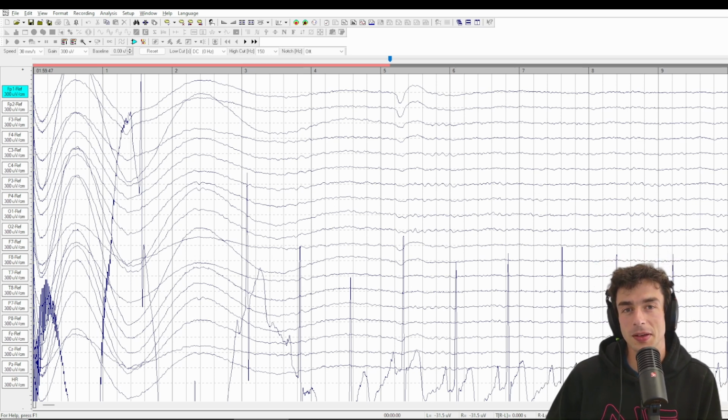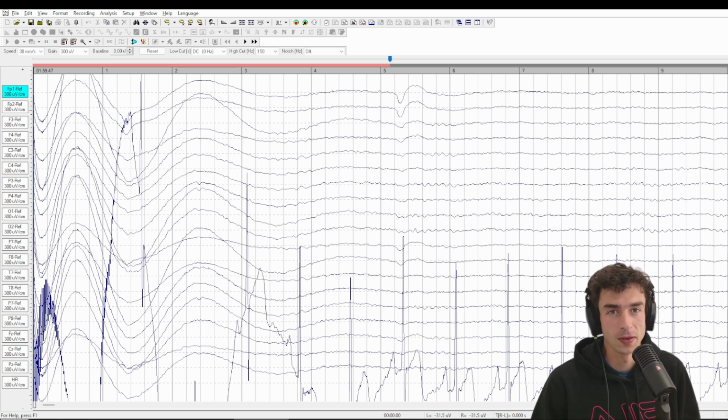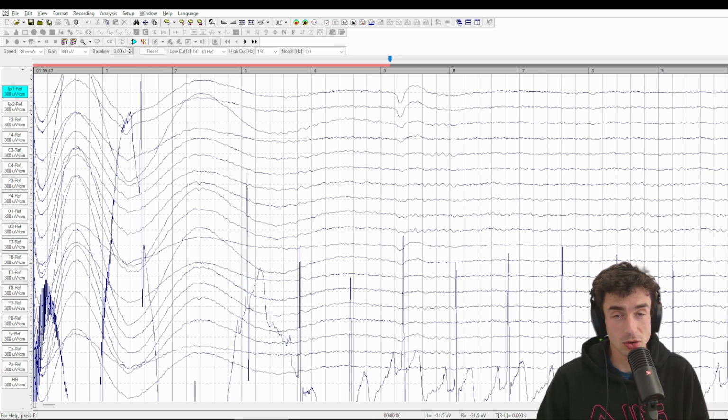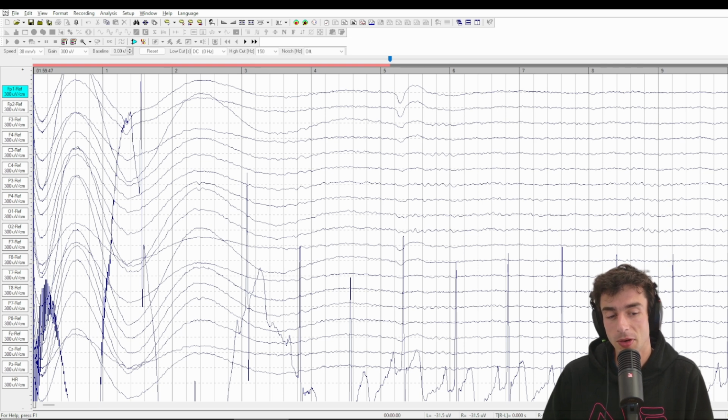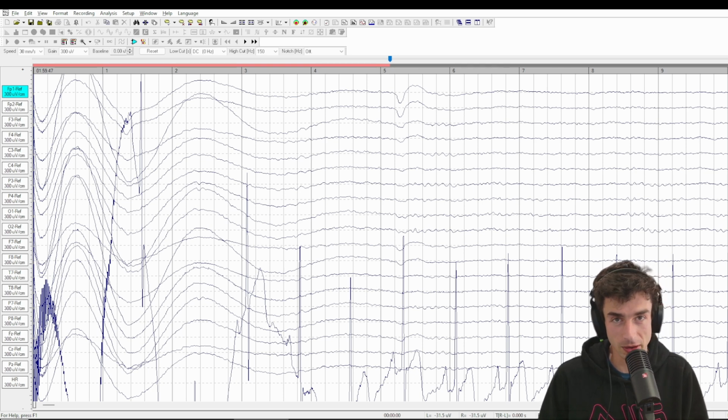My name is Nikki, and today we're going to be analyzing an EEG. Thank you to James Kroll from Bay Area Peak Performance for submitting this data. I've not seen this data yet, and we do have some clinical info, and we're just going to take a look at what's going on.